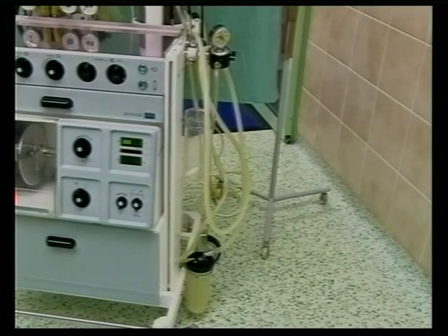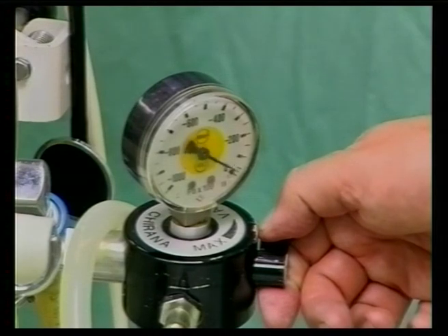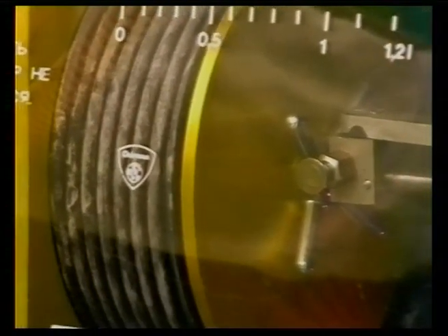The next parts, which are very important and according to which anesthetic machines are classified into various categories, are the accessories. The basic equipment is a suction device, and the most important, a ventilator, a device used for artificial pulmonary ventilation.